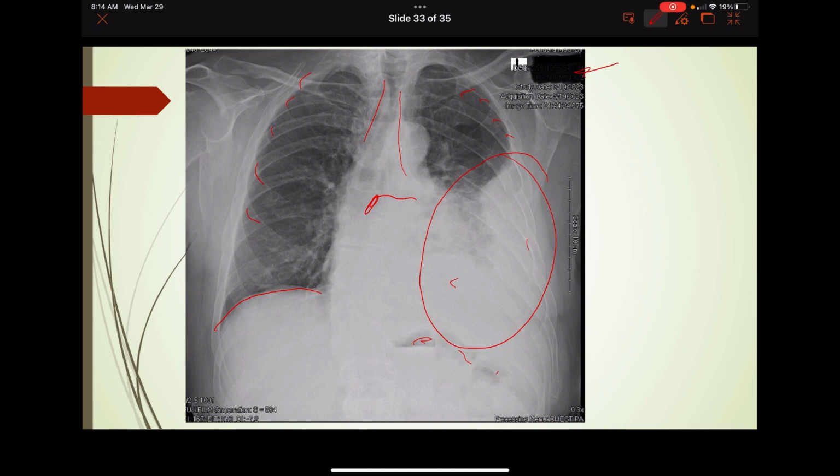And this guy, I remember, he was actually doing pretty well, and this was old. He had started having problems a couple of weeks prior, and had fallen. Let me go back to bones here. So we skip the bones, make sure it's the right patient. So ribs on this side look okay, but the ribs here come down.